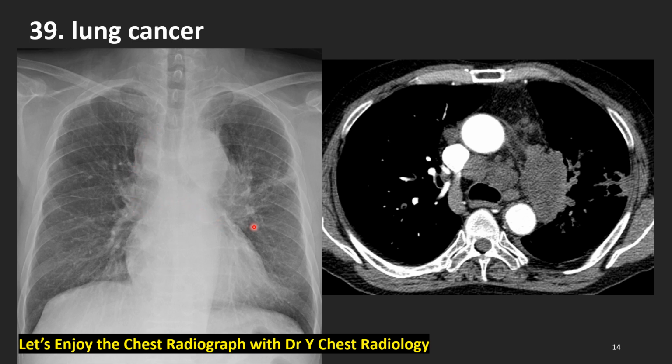small cell lung cancer. On this axial contrast enhanced CT, we see the primary lung cancer of small cell lung cancer here in hilar and mediastinal bilateral adenopathy of small cell lung cancer. Small cell lung cancer is surely famous for smoking-related lung cancer.